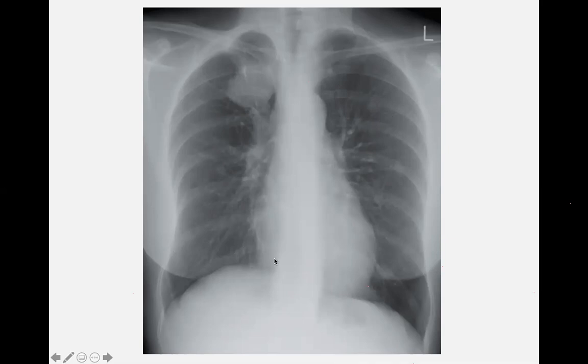Okay, so moving on, after that, what would you say about the rotation? هل هي بالنص، يمين او يسار؟ نص تقريبا. بالنص. اوكي، مع ان هذه الصراحه هم مو واضحه لان البنتريشن مثل ما شايفين, you can't see the vertebrae. So it's a bit hard to tell, but yeah, it's sort of in the middle.